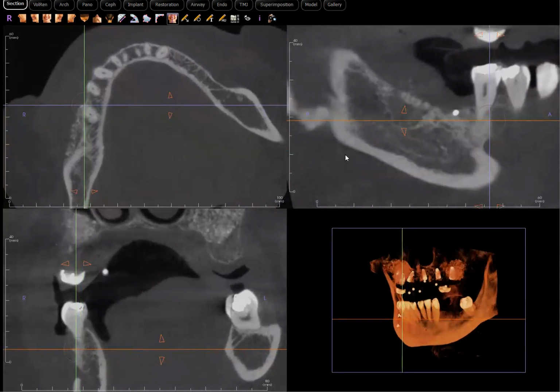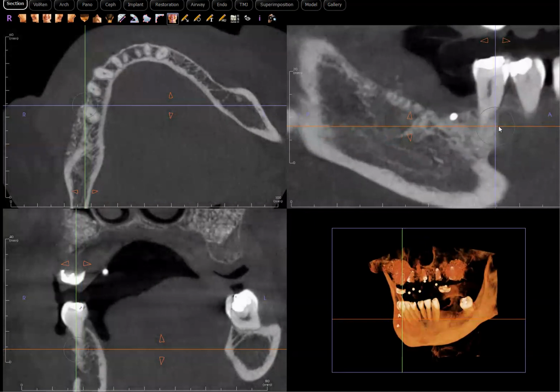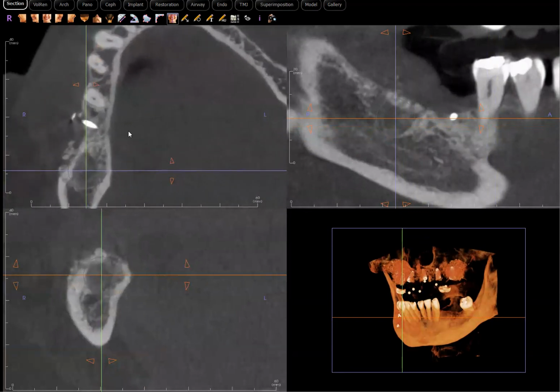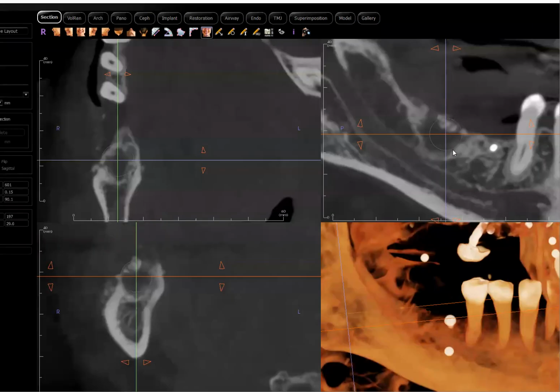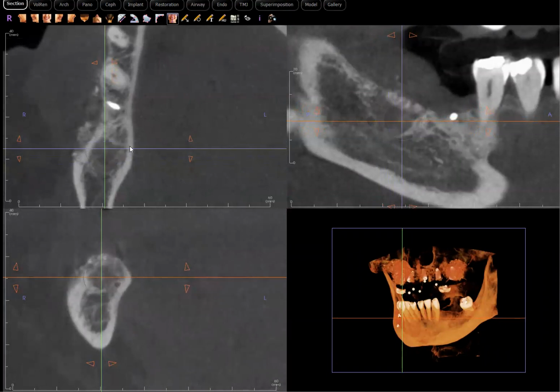All right, so what do we see now? After 3 months, what we see is, thankfully for the patient, a lot more calcified woven bone, right? That's looking a lot better than what we saw previously. Let me bring that over here like this, right? That's a lot less radiolucent. So that's good. It has healed, and I'm sure it's continued to remodel, and that looks really, really good.